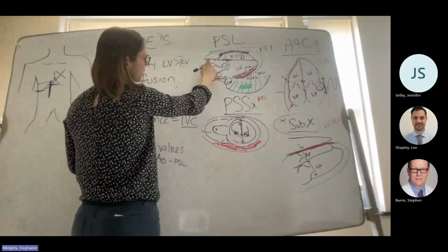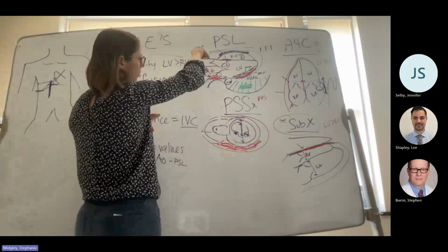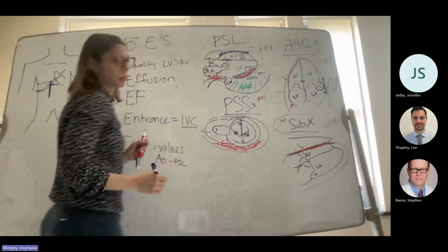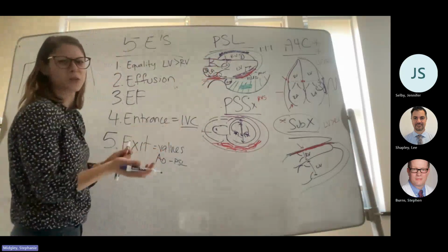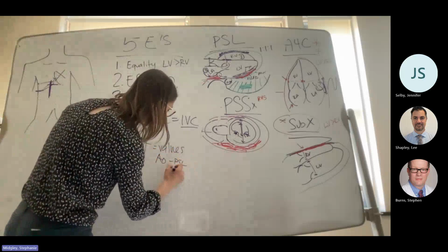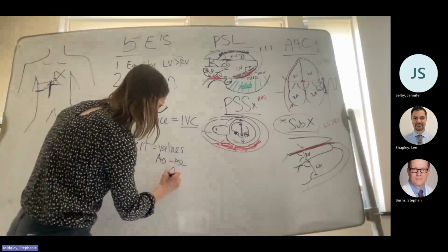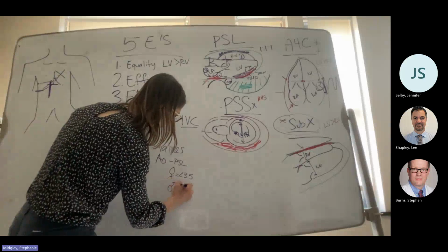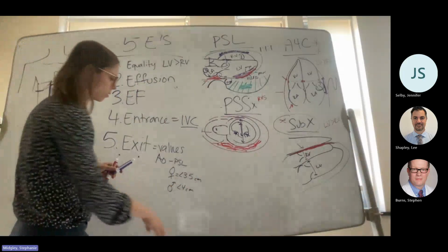And you're going where the tip of the aortic valve leaflets are when they come together. So when you're at the very end of systole, you're going to measure the outer wall to the inner wall. It's really weird. Cardiology does annoying things like that. They also do all their echoes backwards from how we do to make my brain hurt. But normal, the textbook answer is it's classified by your body surface area. But for us simpletons, we like females should be less than 3.5 centimeters and men should be less than 4 centimeters. So those are just nice, easy reference numbers.